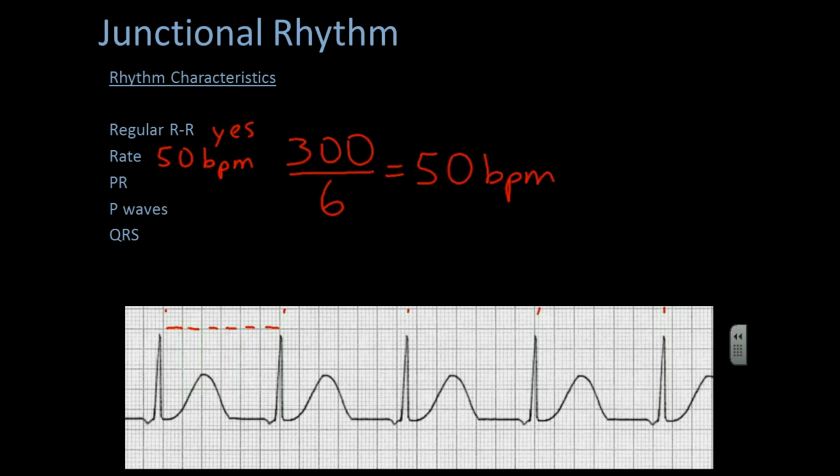What about the PR? Well, PR looks pretty short. I would probably say maybe 0.10. And that's definitely less than 0.12. P waves. All right, so are those P waves upright or are they inverted? They look pretty inverted to me.